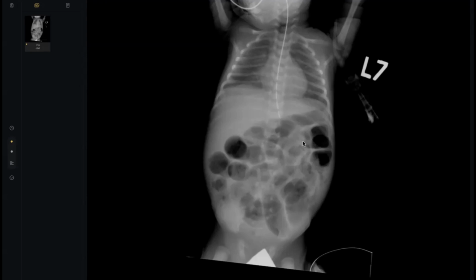Doctor, could you show me exactly where the signs of necrotizing enterocolitis are? Use the arrow, please. I think maybe this is a double wall sign. No, no. Where are the signs of pneumatosis intestinalis here? Which part of the loop? Show me. Is this the loop? This one, in the right lower quadrant. Excellent. And this appearance? Mottled appearance.